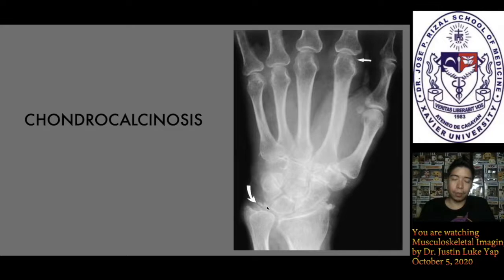So that's here. Your clue is that these areas don't usually have calcifications or bones. You don't expect to see them. Usually these calcifications are more or less linear or rice grain in appearance, so they're just elongated. And again, you look for the clinical history since these patients will present with much pain at the specific sites where the calcifications are seen.